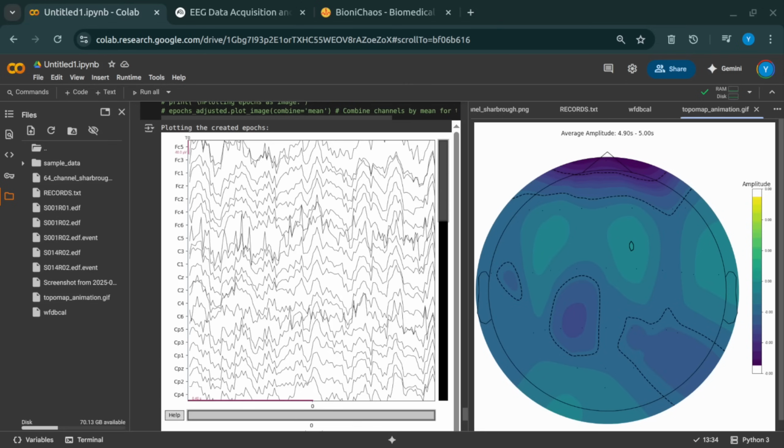We tried interpreting the binary content, attempting to read segments as integers to maybe find event timings or codes. We even managed to interpret the last 8 bytes, which seemed to correspond to an event ID of 1, which actually matched the T0 we saw in the other annotations. Ah, so T0 means ID 1. Sort of. But here's the kicker.